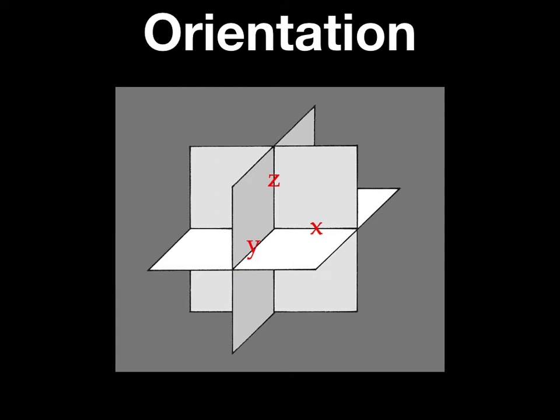The next thing I want to talk about is orientation. While musculoskeletal ultrasound encompasses a variety of scans, the technique across these various uses remains the same. Whenever a structure is being examined, such as a tendon, this should be done systematically, evaluating the anatomy of interest in 2 orthogonal planes. The reason this is so important is because artifact will often be seen and can be misidentified as pathology. That's why it's always useful to look in 2 planes and be sure that what you're seeing is actually true pathology and not just an artifact, a shadow, or you simply lifting your probe off the skin.